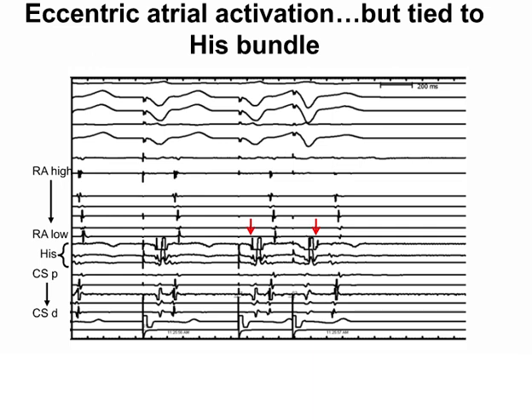Here's a case where the patient was referred to me for ablation, and they thought it was AV node reentry, and it turned out to be a pathway. They had done lots and lots of ablation in the posterior septum trying to get rid of the slow pathway, but never quite hit the accessory pathway. So the activation sequence in the CS looks very funny. It looks like the mid to distal CS is the earliest. That doesn't really look like what usually is through the AV node, but after ablation in the posterior septum, you can't use the activation sequence in the coronary sinus reliably any longer.